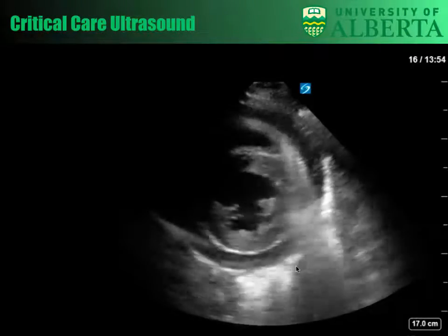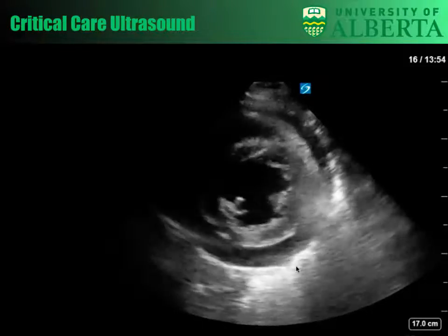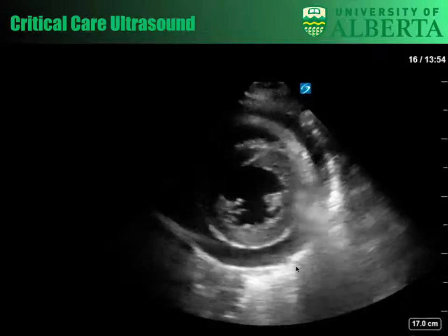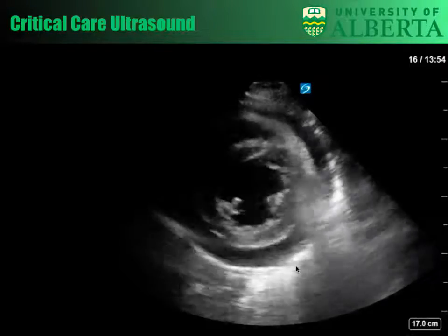Okay, let's get back to you there. Which view is this? Short axis. Short axis. Excellent. This is the green one there.